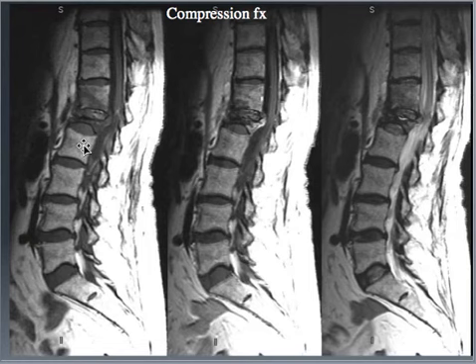These are what we call compression fractures. So compression fractures can happen in elderly patients without really much damage. It's usually from the impact, either sometimes just falling on your butt, it can compress the spine, or falling and hitting the top of your head. So either one of those, what it does is it pushes the spine together and it can cause that compression fracture. They tend to be more common in elderly patients, but we can see them in younger patients due to trauma.